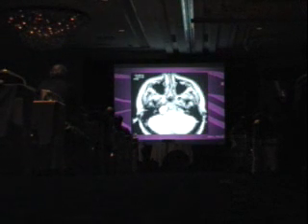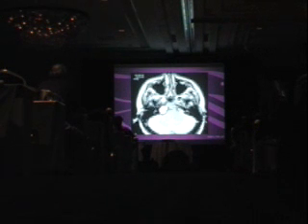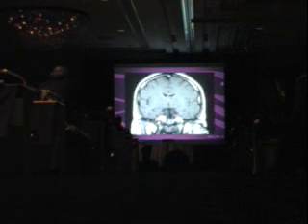Sinuses, skull base. Again, I'm going to leave the anatomy to you guys in just the 2 minutes that I have left. I'm going to just go through what really the major differential diagnoses are in this location. Okay, so this is pretty much an anatomy mini-lecture. In the petrous apex, if you have a T1 bright expansile mass that does not enhance, may or may not be T2 bright as well, what is it? Cholesterol granuloma, also known as cholesterol cyst.